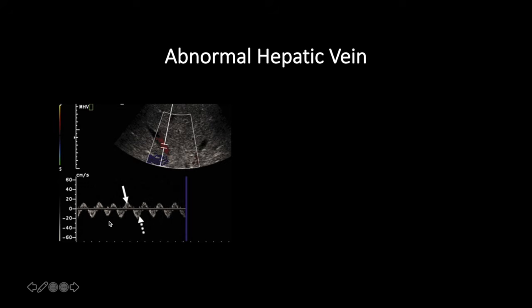Okay, so if the first thing you notice is that this is pretty pulsatile, you'd be correct. So this is likely a cardiac cause of this abnormality. And if you look at this waveform and you were paying attention in the last little bit, you'll recognize that this is the classic appearance of tricuspid regurgitation. So we have a retrograde ASV wave that's all bunched up into one here, and then anterograde diastolic flow here. That systolic filling should usually be down here where my mouse is, but it's actually reversed and it's kind of all melded into one here.